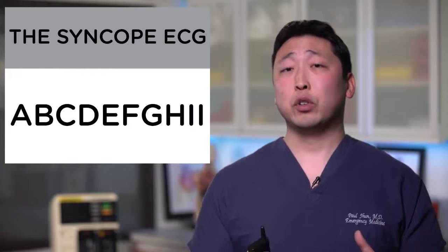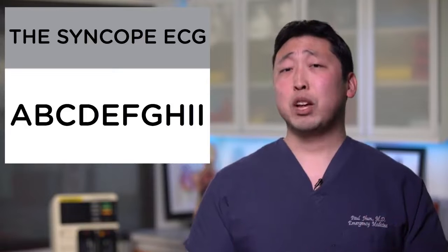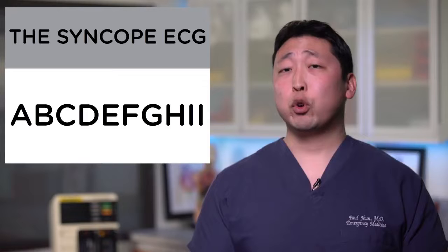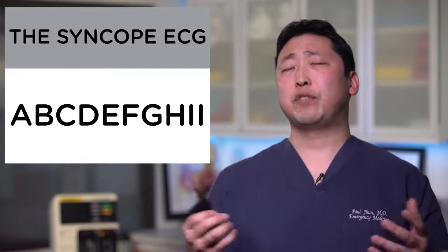The first I is for intervals. We talked about the corrected QT. How about the PR? Second-degree heart block type 2 Mobitz pattern, third-degree heart block or complete heart block. Maybe the QRS is widened: new onset left bundle or right bundle branch block, or a bifascicular or trifascicular block.